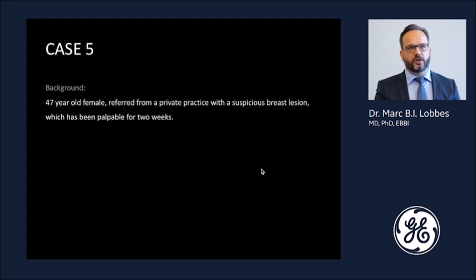We do this because we think that it helps us in the preoperative staging. We can easily assess the tumor extent, whether there's multifocality or multicentric lesions, or if there's any contralateral breast cancer. And in a one-stop shop approach, we can do the necessary biopsies, and together with the imaging, the preoperative staging, including the axillary ultrasound of both sides, and the final histopathology results, they can go to their first visit at the surgeon with a complete package of preoperative staging, which speeds up the diagnostic process a little bit.